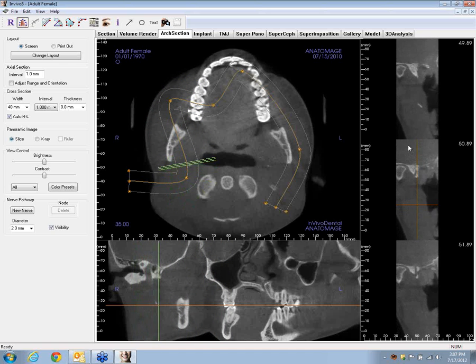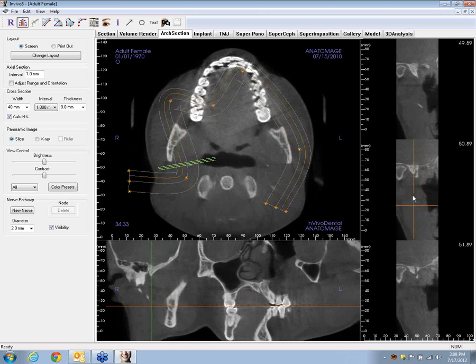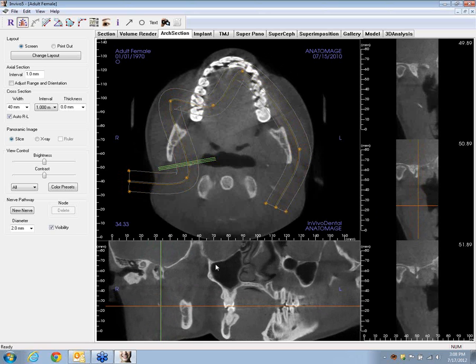The radiology on this is easy because the green line is always showing you the view over here that has the crosshairs in it. All right? These crosshairs are always showing you, the red line is showing you the height of the axial view. The little amber line is showing you the position of our panoramic view. Right? The green line is showing you where the cross sections are. But if I move my little green line, you can see that position jumps as we track those cross-sectional views.